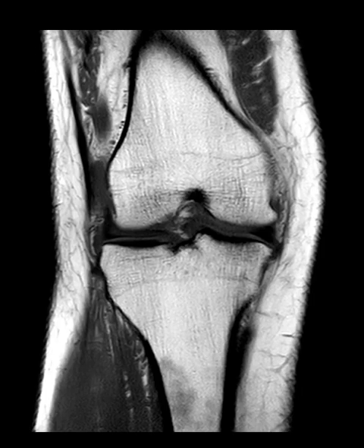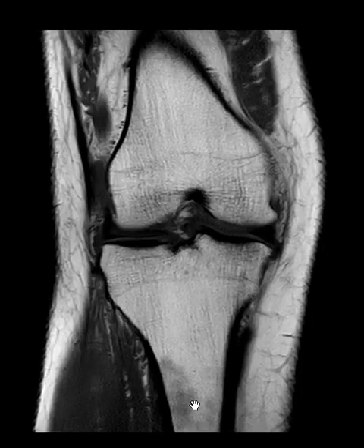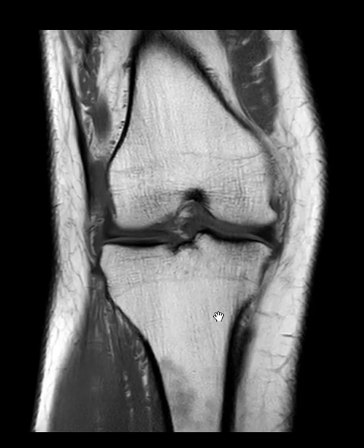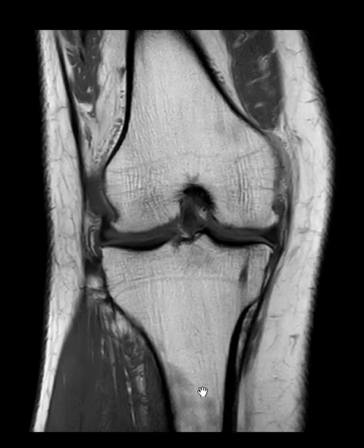And when we think about benign conditions, one of them is high altitude. People who live at high altitudes can have active or red marrow reconversion. They'll get little red marrow areas sometimes in the femur or tibia. People who smoke can have red marrow. Maybe that's one of the more common things to see. So we'll mention that this could be related to red marrow reconversion from smoking or from physiologic stress or living at high altitudes. And another thing that can cause this is anemia. So anemia for any reason can cause the red marrow to become active to compensate. And so we throw these all out there.